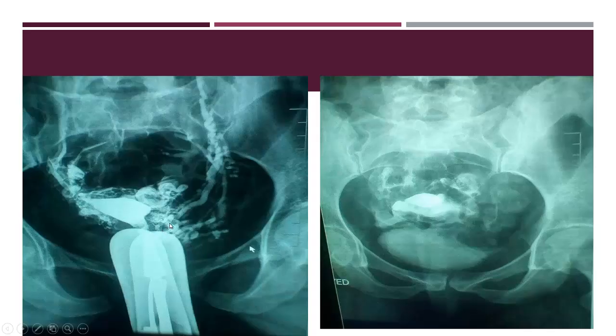Here there is the intravasation. The myometrium here is delineated by vascular and lymphatic structures, with subsequent filling of the internal iliac veins, and the ovarian veins are also filled. The fallopian tubes here are seen and they are patent, but they are seen in the control film also. So this is an intravasation.